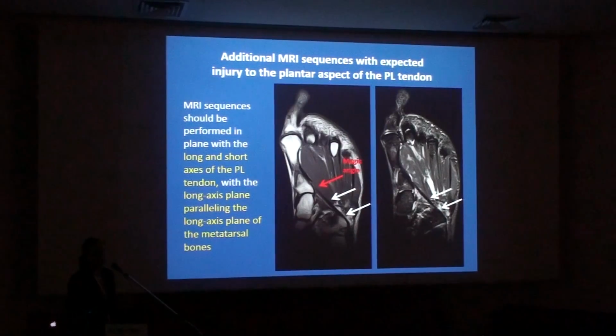And here on the T1-weighted image, there is some increased signal intensity due to magic angle, which is corrected on the fluid-sensitive sequence, where the TE is longer than 38, so we try to avoid that magic angle.